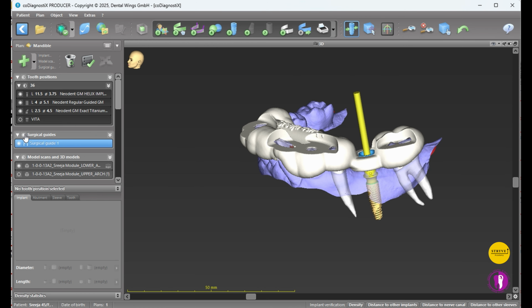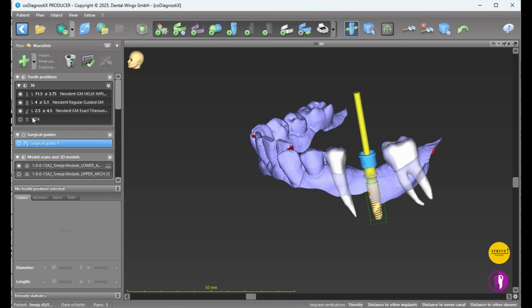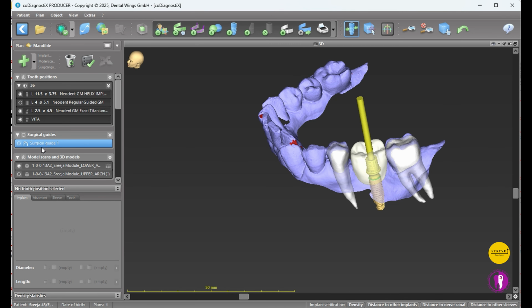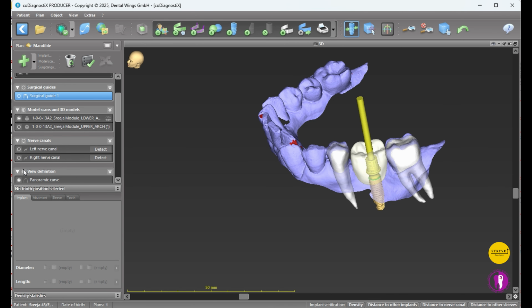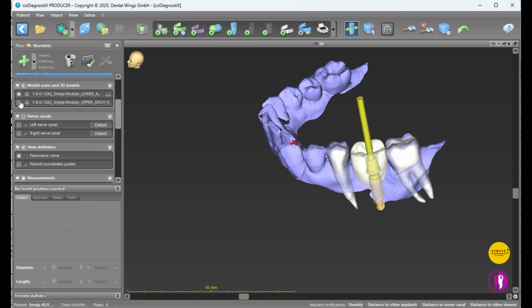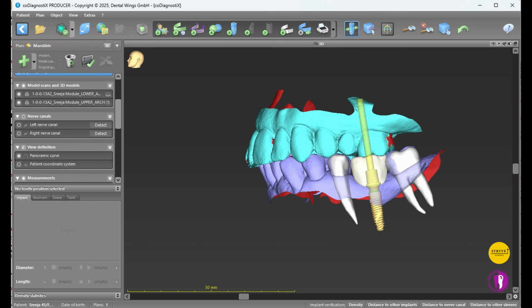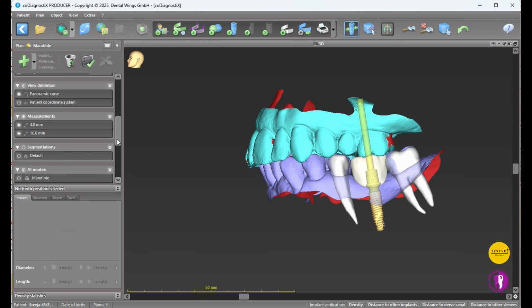All right, and you can also take a printout of this particular thing. Okay, whatever is shown on the screen will be printed as the first page. So you can keep upper, lower, okay, and also come down, add the mandible.